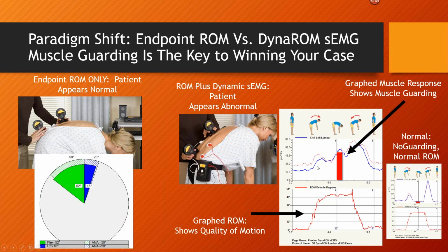Now at the top, you can see blue is left, red is right, looking at the lumbar spine. We're looking at muscle tension, and we're graphing it over time. Now, this big, huge change, putting the pictures in, has made a huge difference in how effective it's been for getting everyone to understand it.